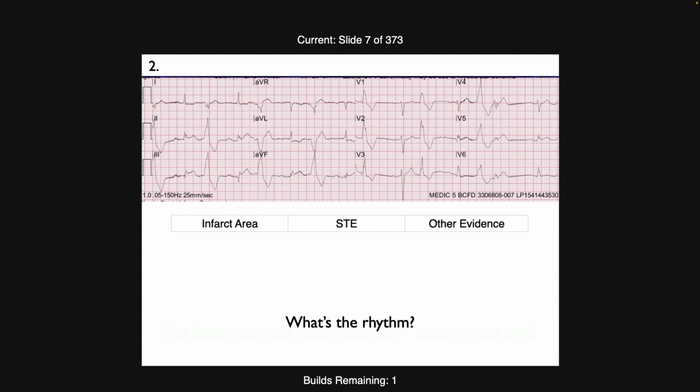Okay, so look at it for a little bit, and then some brave person jump in and tell us what's happening on this 12 lead. So, Kyle, there's a handout in the back. You'll see it.